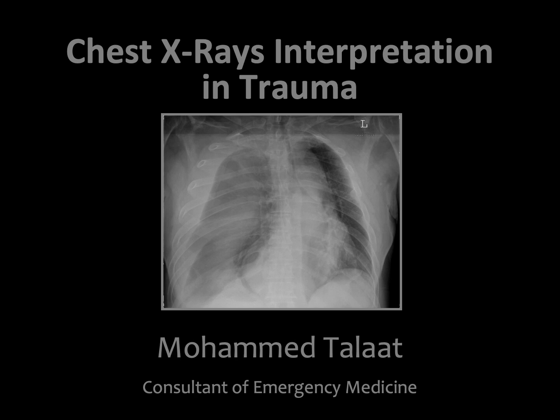And in this lecture, we are going to talk about the chest X-ray interpretation in trauma. As I said, I'm not a radiologist, so I'm not going to talk a lot about the alignment. This film is not sufficient. No, I'm going to go directly to films in the same way we do in the emergency setting.